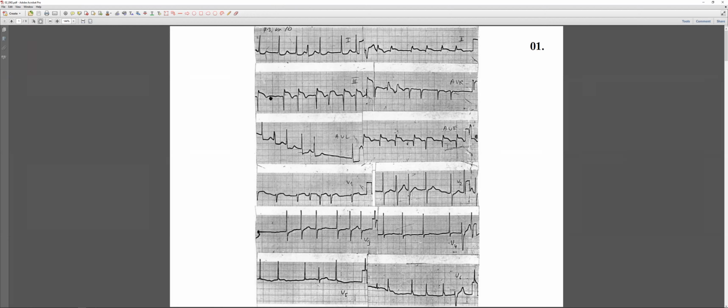Arrhythmia without P wave, that's a... come on. Arrhythmia with different P waves means multifocal atrial impulse formation. Arrhythmia without P wave means... anybody, somebody, help us. Atrial fibrillation. Atrial fibrillation, yes.